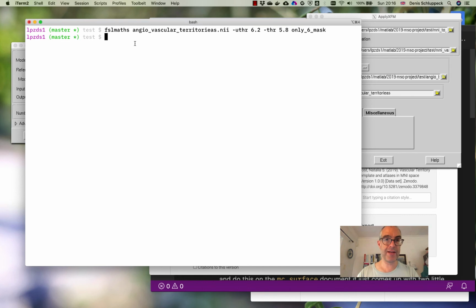So this is going to create an image that has the same dimensions as this one, but has been transformed with these steps in sequence. Okay, and it's actually important that they get run in the right order. You can sort of try and convince yourself that that's the case. If you threshold this first and then the other, I think you might end up in trouble. But maybe work through this with a diagram.